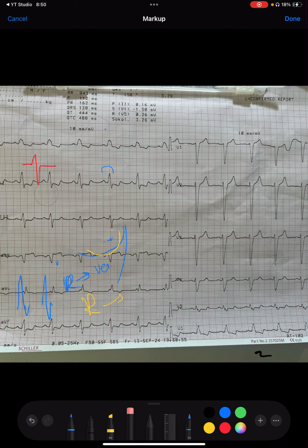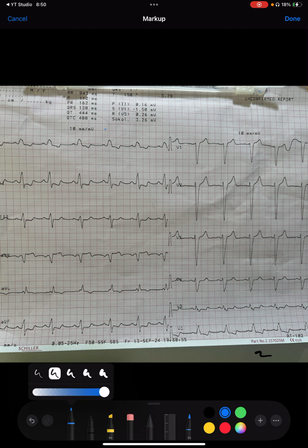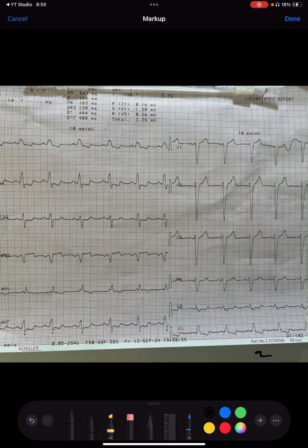Maybe the patient had an extensive anterior wall MI, lateral wall MI. So we can expect the ischemic heart disease or MI must have damaged the myocardium by at least 25 to 30%. That is the reason why we can expect this patient to have an ejection fraction of around 30%, which was the case here. This patient had an EF of 25 to 30% only.